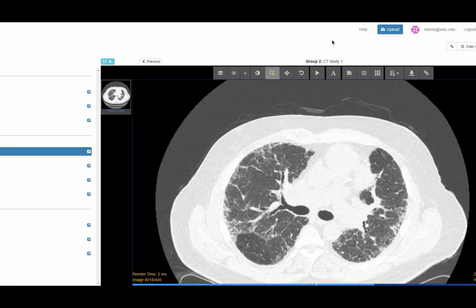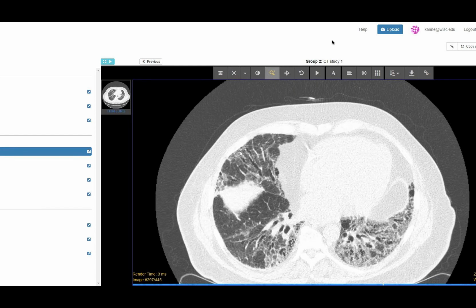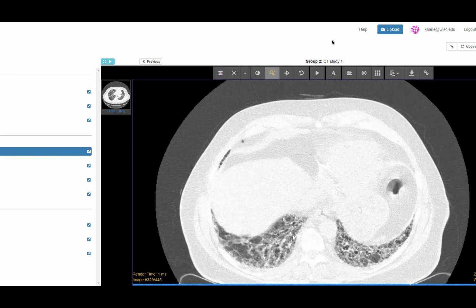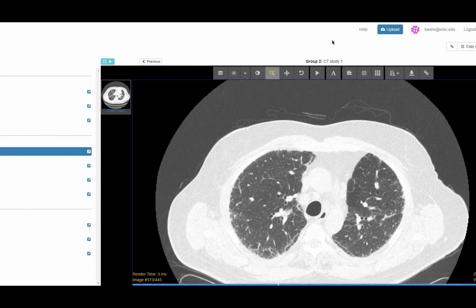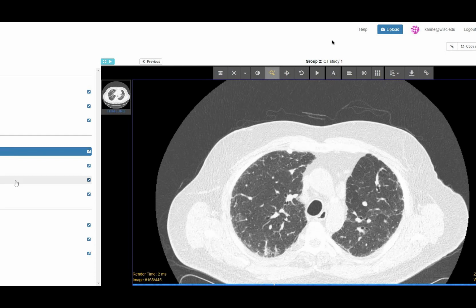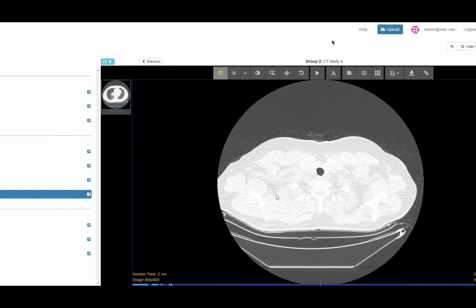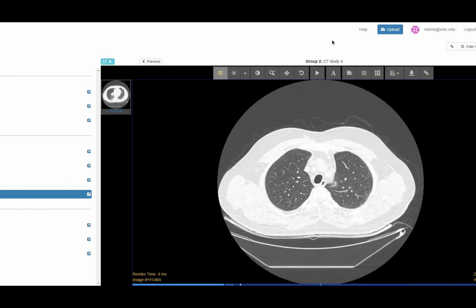And if this patient came in for an ILD evaluation, I think most of us would go down the fibrotic NSIP route. You've got peribronchial predominant reticulation, ground glass, traction bronchiectasis. It's strikingly basal predominant. And you look in the upper lobes, and there's a little bit of air trapping, but not much. So I think it's a pretty good look for a fibrotic NSIP. But what's interesting is if you go back about 10 years, I should have gotten all the scans. This is how the patient initially presented.